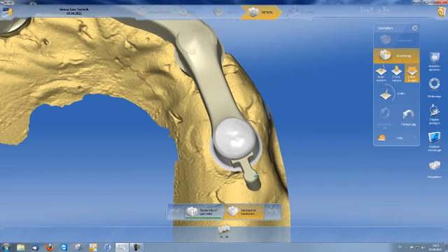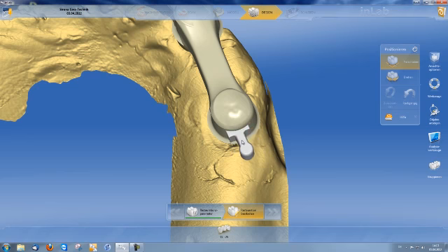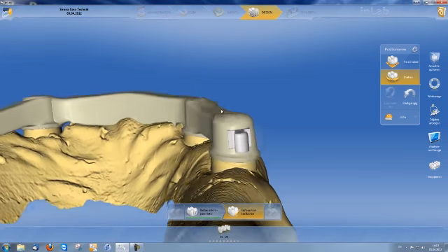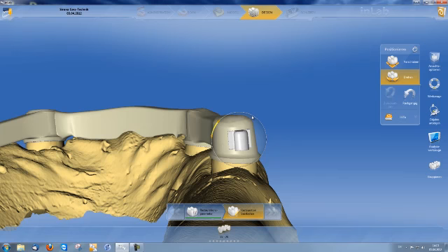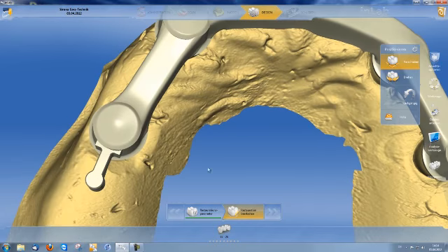The same applies to the attachment. I can change my contour and position here. I firstly change the position of my attachment. I rotate it. However, I must take care here. If I move it into my axis, I lose my telescope angle, and thus I only rotate it. I move it in slightly, and also do the same on the other side.